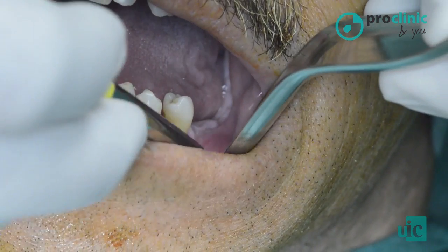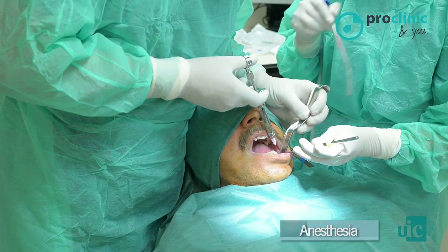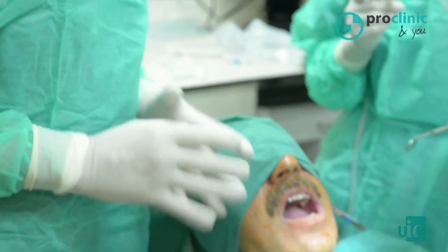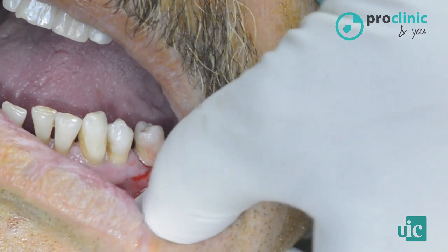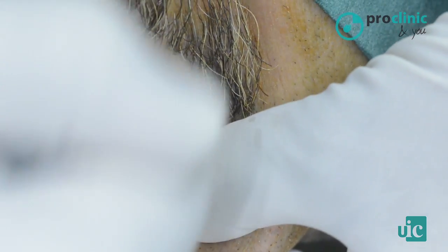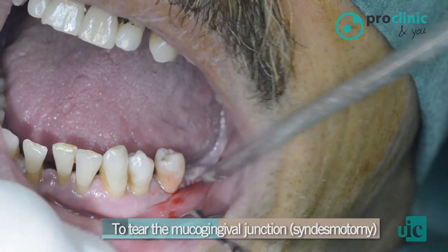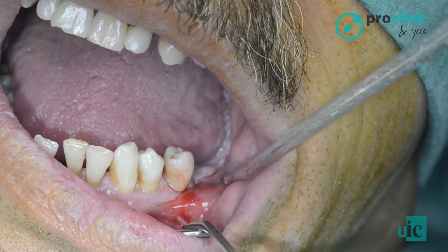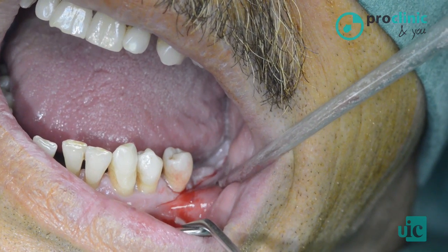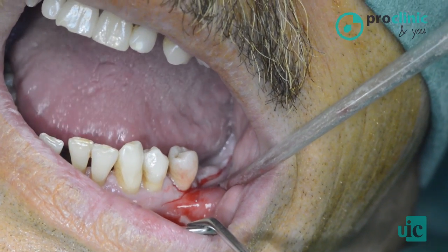What we have to do first is to anesthetize. These are the stages of the exodontia. Once the patient is anesthetized, we proceed to break the mucogingival junction, the gingival attachment. This is called syndesmotomy. We can do it with a dental elevator or with a syndesmotome, although the last one is not used much.